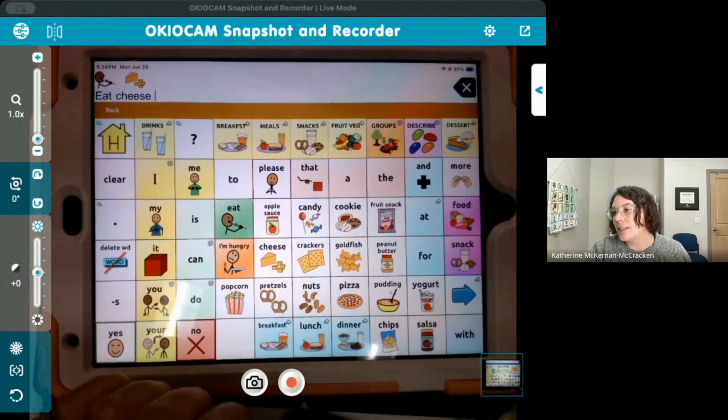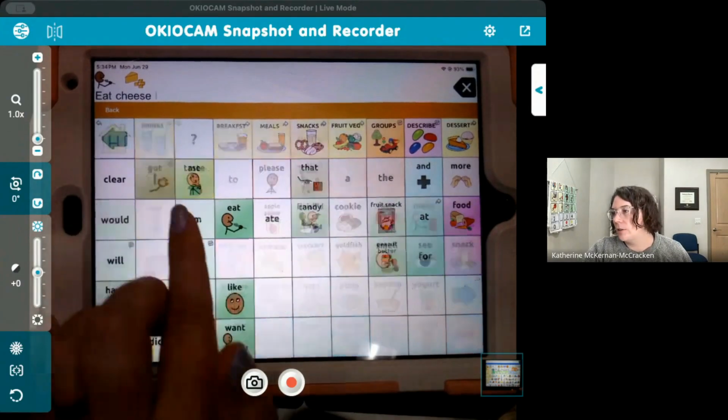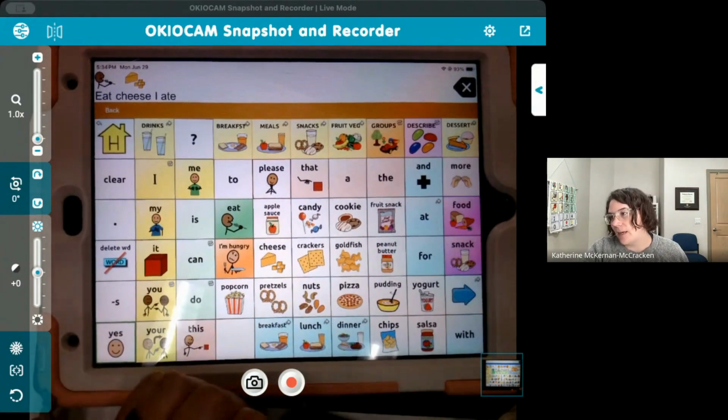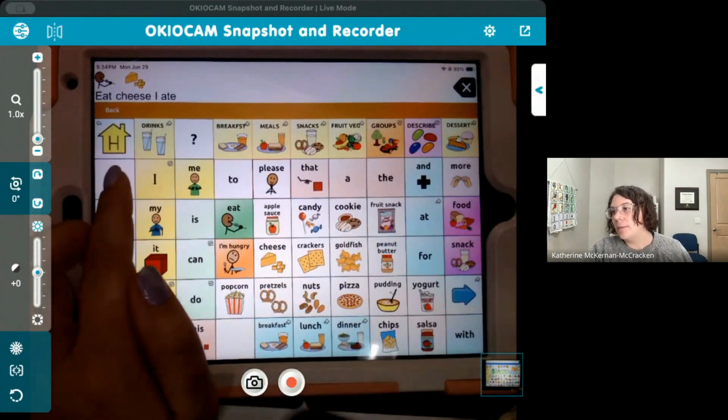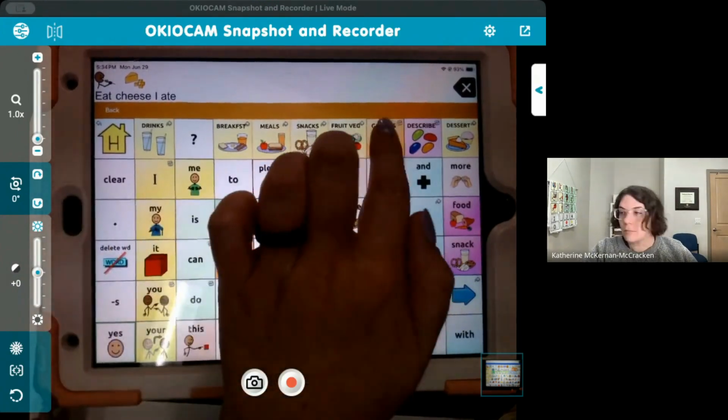And sometimes when you press the button, it will take you to a new page and then bounce you back to the page that you were already on. It does take some getting used to, and sometimes for AAC users, the jumping around between pages with that attempt to predict what you might want to say can be disorienting.